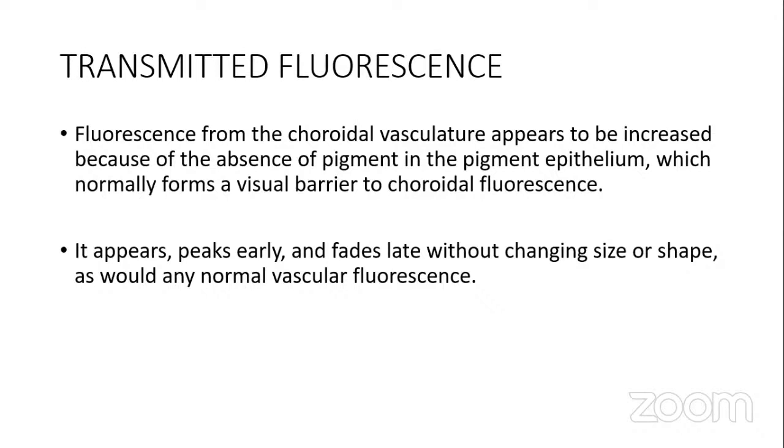It comes in early, with the timing of the choroidal fluorescence. Okay. If it's just that way, it fades the way it came, and there will be no change. It's just a defect. It's just like you're viewing the choroidal fluorescence directly. It comes in early, it fades out. It doesn't change in shape because the window remains the same size. What you're seeing remains the same size.